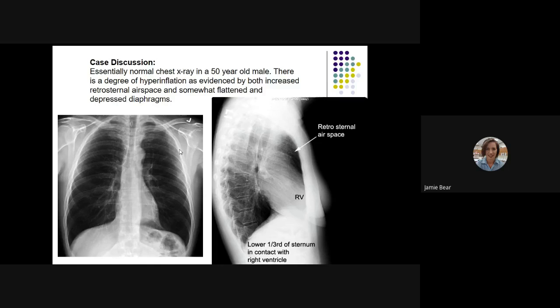One thing this image shows, which I think is absolutely perfect, is the trachea. You can really see that airway, and you can see the symmetrical lining of the trachea. What I think is really good here is the carina. Can you all see where the left and right main stem bronchi branch off of each other?